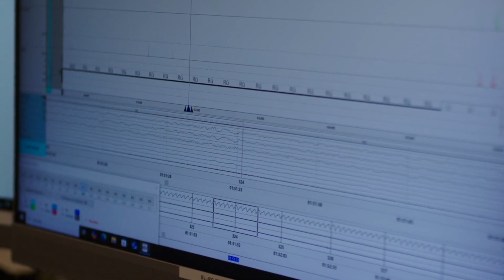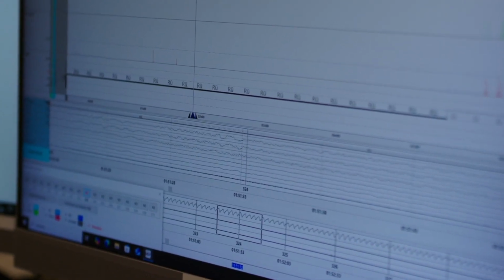Here we see the sleep onset phase starting from being awake, then he goes into light sleep. How long is the sleep onset phase? The sleep onset phase for him was about 10 to 20 minutes. So not that long, you know. So normal? Completely normal. And then he enters light sleep, here into stable light sleep, and then here into deep sleep. This is one sleep cycle with the REM sleep here at the end. These are the thick bars. And this here is the REM sleep.